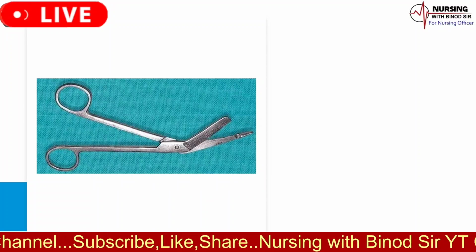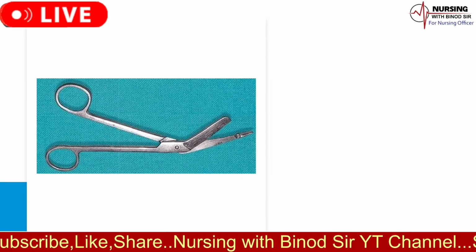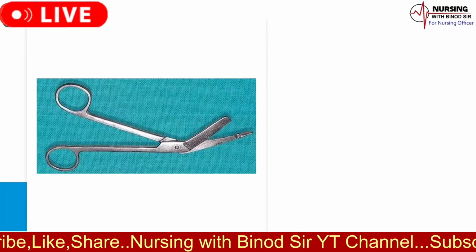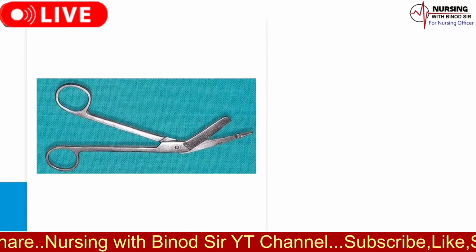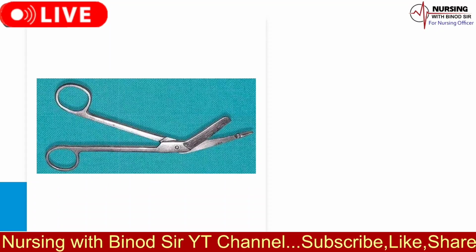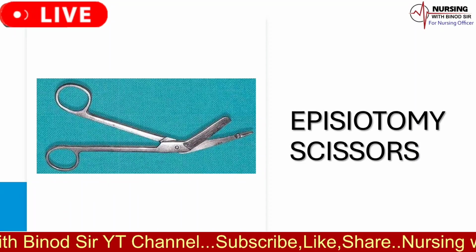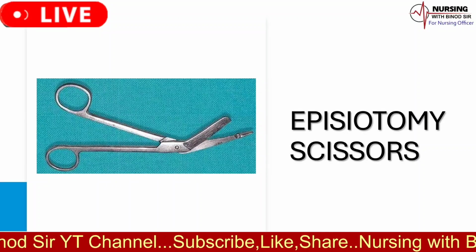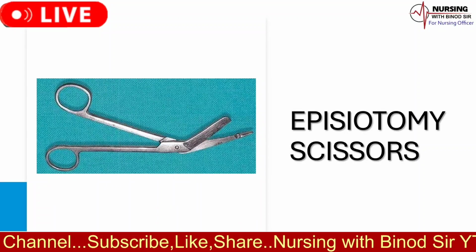The name of the instrument is episiotomy scissors. The uses of episiotomy scissors is as follows. 1. Perineal incisions during childbirth. Episiotomy scissors are used to make precise, controlled incisions in the perineum during childbirth, aiding in the baby's delivery by enlarging the vaginal opening.